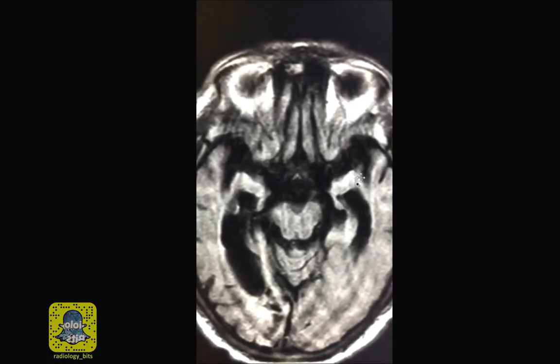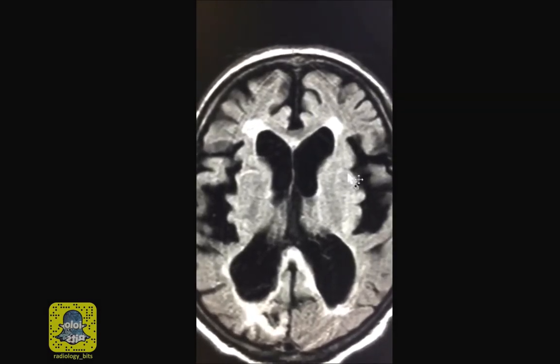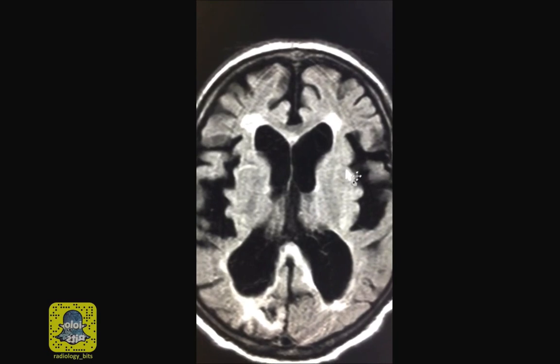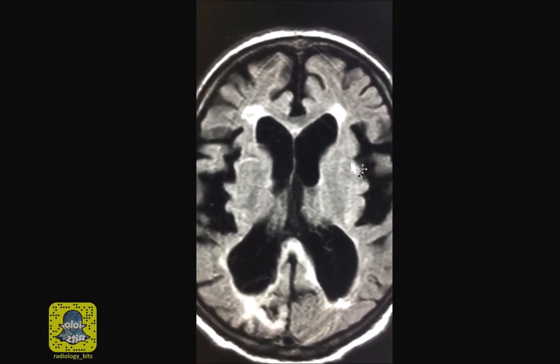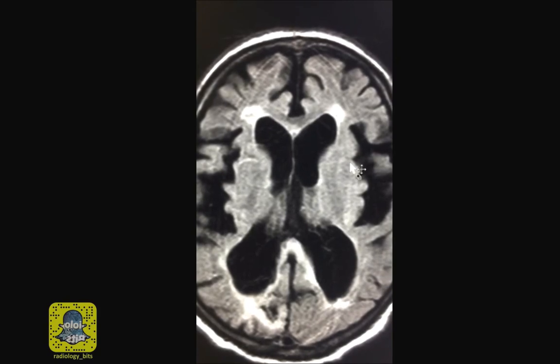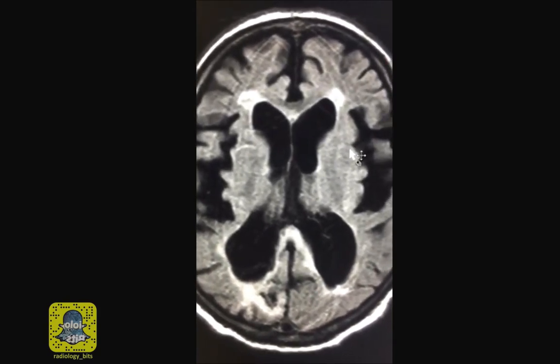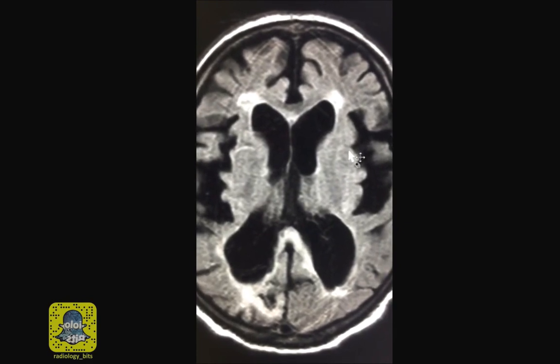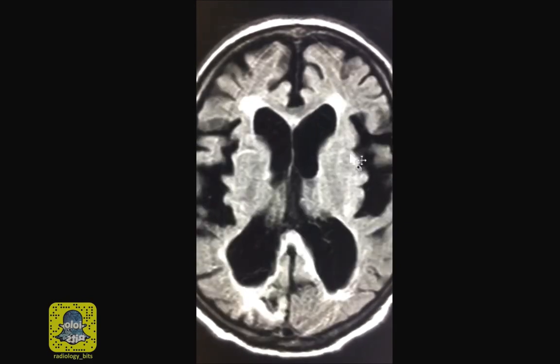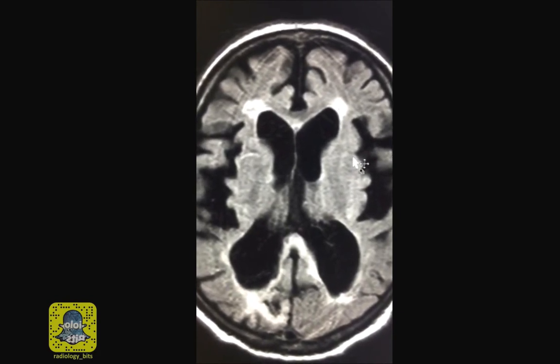However, don't overcall this entity since lots of patients have volume loss and more pronounced ventricles without having the disease. And it's extremely important to correlate the image with the clinical presentation, since if this is a true finding, treatment may be effective. When normal pressure hydrocephalus is correctly diagnosed, shunting or lumbar puncture may improve the patient's presentation.